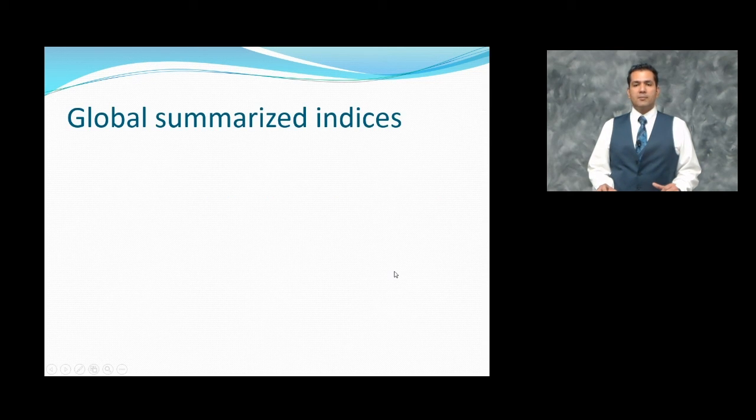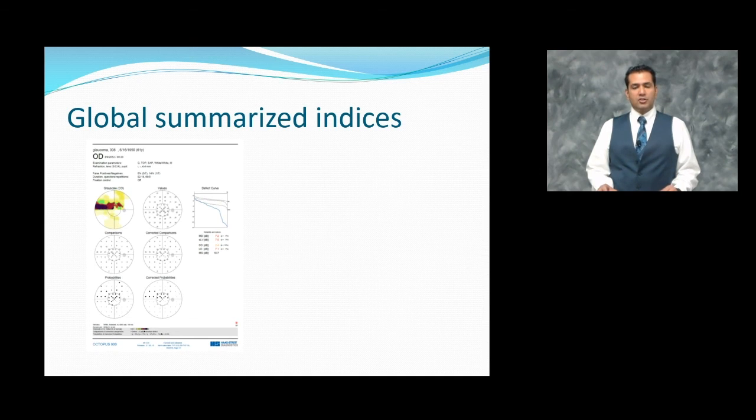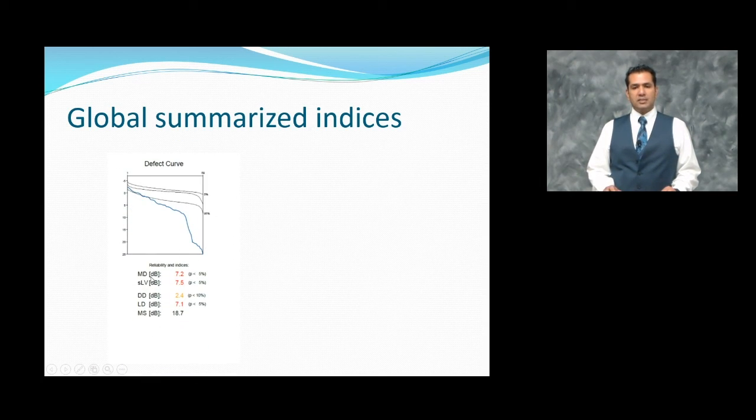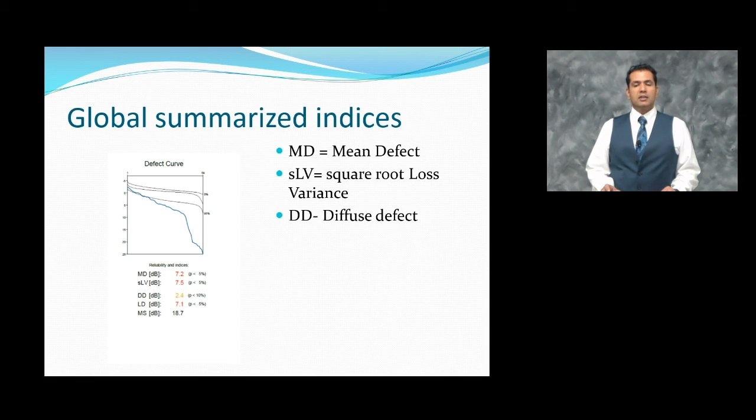The global summary indices are number representations of the entire visual field plot. So you have the overall visual field, and right here, just below the Bebie curve, you see the global summary indices. It looks like this. MD represents mean defect. SLV represents square root of loss variance. DD represents diffuse defect, and LD represents localized defects.